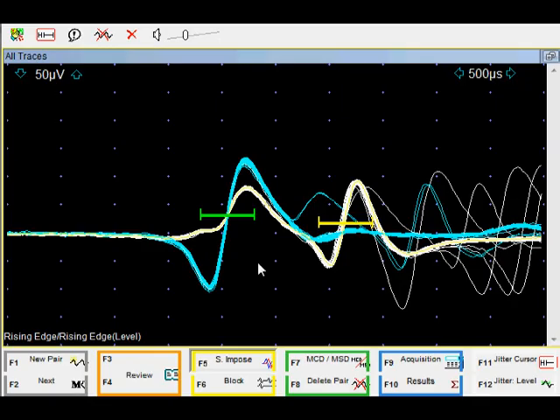So in this case, we have mixed discharges from two different motor units. The white signal is the action potential pair. The blue waveforms have only one action potential. They don't cross the second window. So in a sense, this looks more like a blocking phenomenon. Let's see how the system handles it.